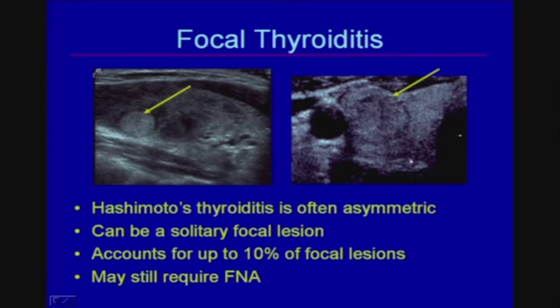And if you biopsy this, you may get back the diagnosis of focal thyroiditis. We saw about 20-some patients, and we published our results that we would not have specifically diagnosed this as a patch of thyroiditis, yet that can happen. And in large surgical series, you'll see that sometimes up to 10% of focal abnormalities, seemingly in an otherwise normal appearing gland, can be a very focal presentation of thyroiditis, and our pathology colleagues are well aware of that.